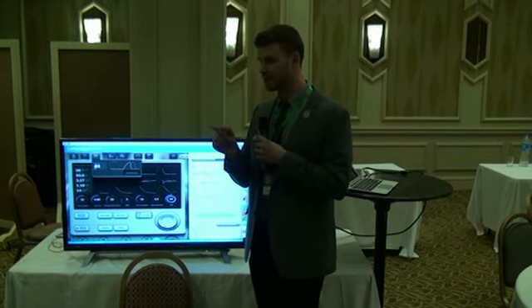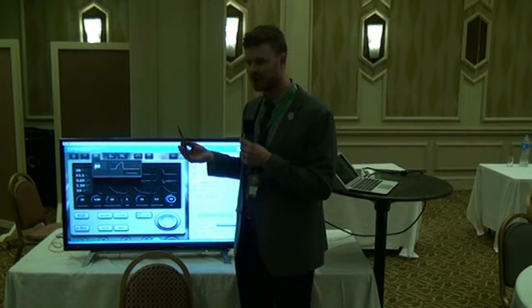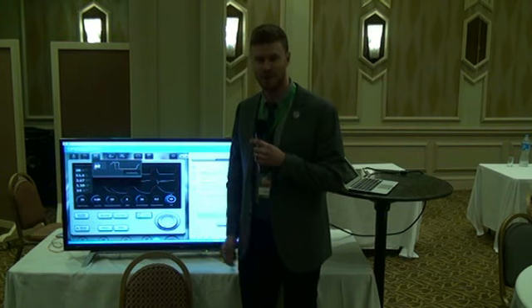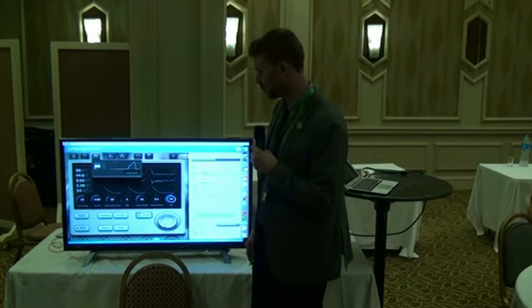Phase 3. Oh, phase 3. Yeah, so it's definitely a phase 3 problem. But there's the name, we call it shark fin. I don't know why we always have to come up with these cute names, right, to remember things. And so we have things like shark fin and some other things that I'll show you as we go on through the cases.